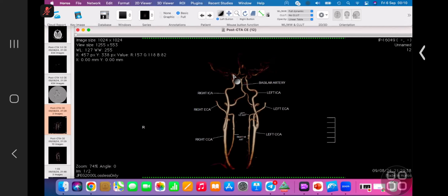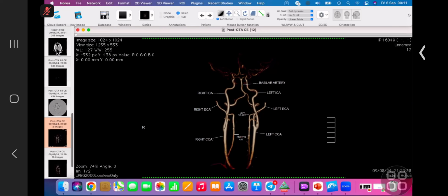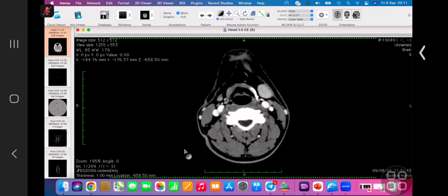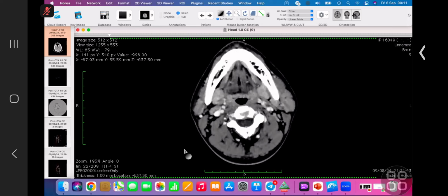So this is a case of reversible vasoconstriction syndrome. Have you heard of this? RCVS? Sorry, doctor, again? Reversible cerebral vasoconstriction syndrome. So in a young patient, you should think of this pathology. The close differential has to be primary CNS angiitis. These two conditions will usually have this kind of appearance. Young patients who present with other associated findings that you may encounter are subarachnoid hemorrhages and stroke-like symptoms. That's the very typical history.